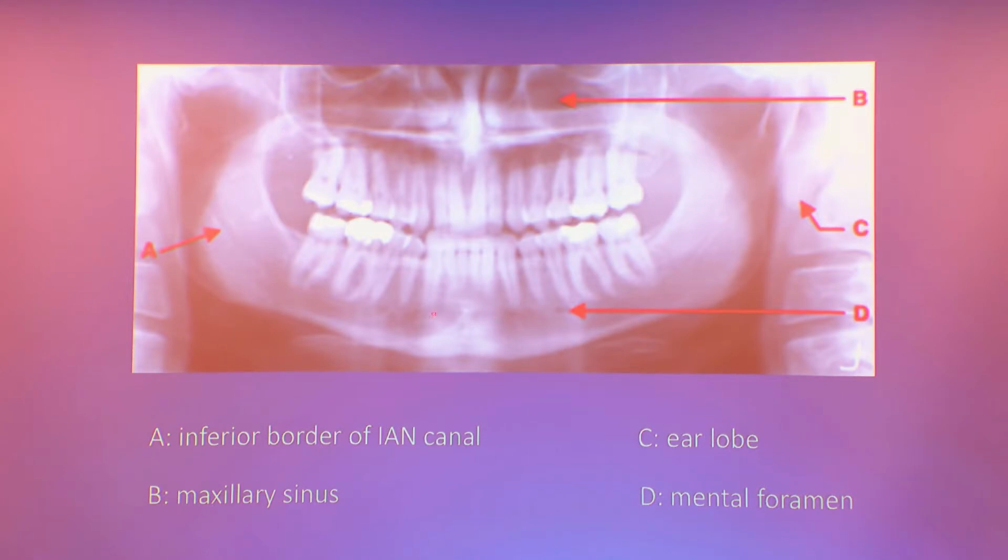If you look at the anterior mandible in this region here, we have the opacity, which is the shadow of the cervical spine. But then there's also a hint of a lucency through here that has this superior border that looks like a horizontal line of contrast. That lucency is related to the disc space.